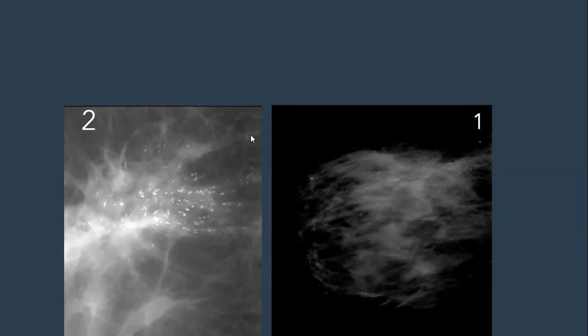Because of the limitations, I cannot say. It might be regional, it might be segmental, but it doesn't matter. Regardless of distribution and regardless of the associations, if I just have these calcifications without anything, it will be BI-RADS 4C. Regardless of distribution, it's 4C. And associated with this significant asymmetric architectural distortion, it will be upgraded to 5.